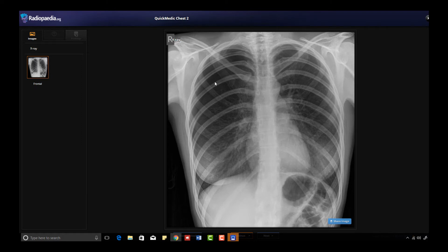So what's caused this pneumothorax? Make sure there's no fractures in the lady. Make sure the rotation is okay. So it's slightly off-centered. You can see the clavicles here, the other clavicle here, and your spinous process is not quite in the middle of them. So potentially it's slightly rotated, which is why the heart is shifted towards the right a little bit. You could almost say it's a shoulder forward x-ray. On exposure, this looks like it's adequately exposed and penetrated. So then going forward, let's see what this looks like here.